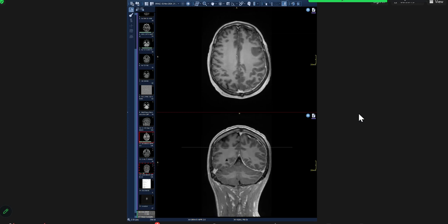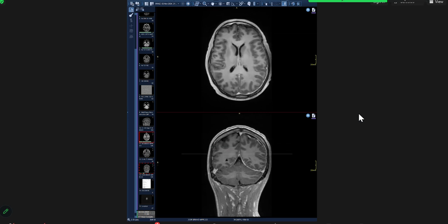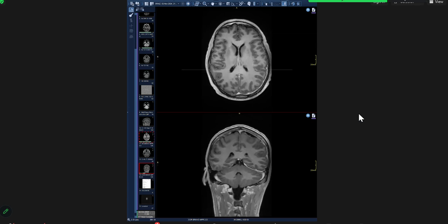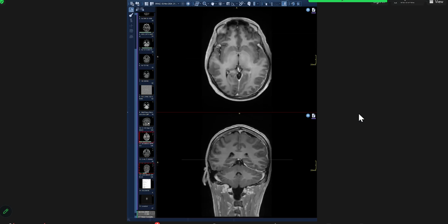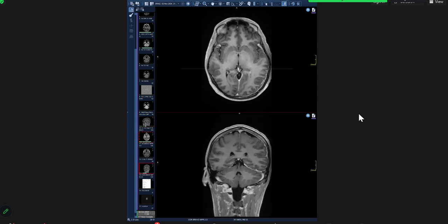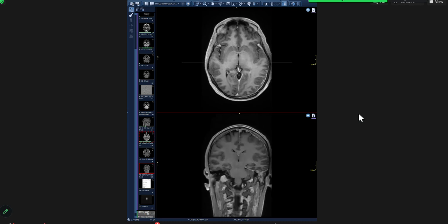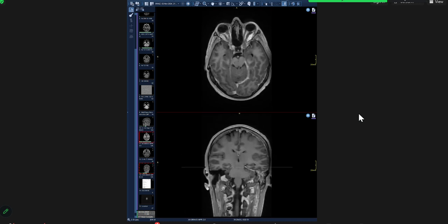You said you see meningeal thickening. What are the possible causes of it? Ma'am, there can be intracranial hypotension, or there can be infection or meningeal carcinomatosis. So the tonsil is normal, so it is not intracranial hypotension. Okay, so what else are you thinking about?